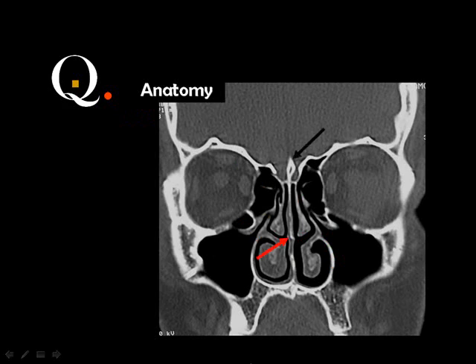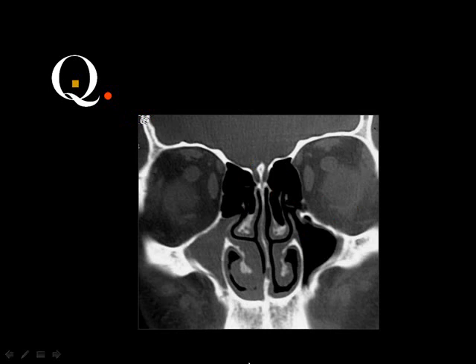What do you think about this? Nasal septum and crista galli and cribriform plate and middle turbinate. What is the diagnosis in this case? Maxillary sinusitis, is not antrochoanal polyp. Yes, okay. This is maxillary sinusitis with hypertrophy of the inferior concha and some thickening of the nasal mucosa. And you can also see a concha bullosa on the opposite side.